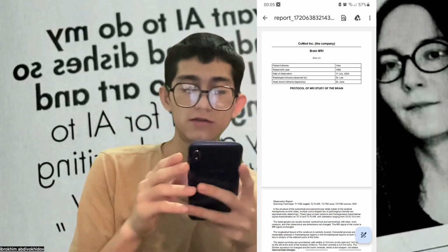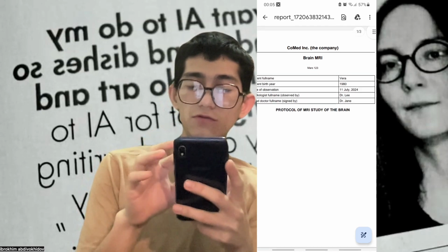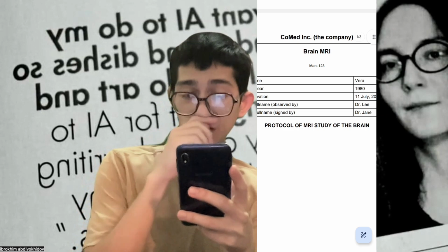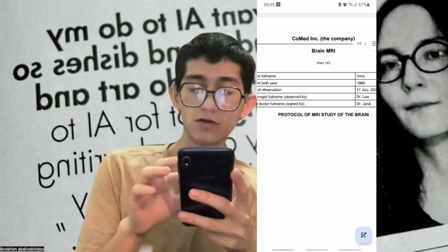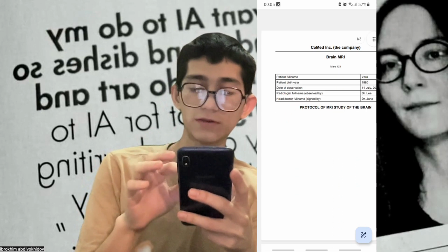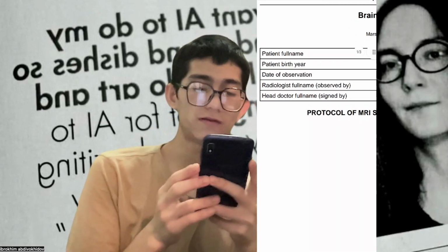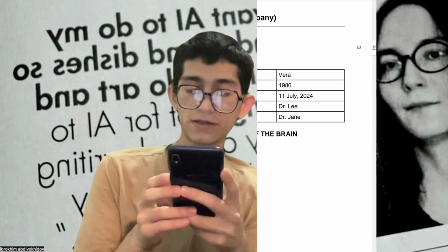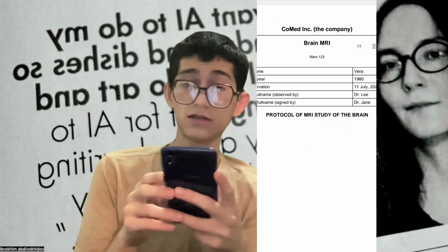Here you can see the report and above you can see the full name of the hospital and the brain MRI. It's a department and here you can see the address of the hospital and the patient's full name, patient birth year, date of observation, radiologist full name, and the head doctor who signed and generated the report.